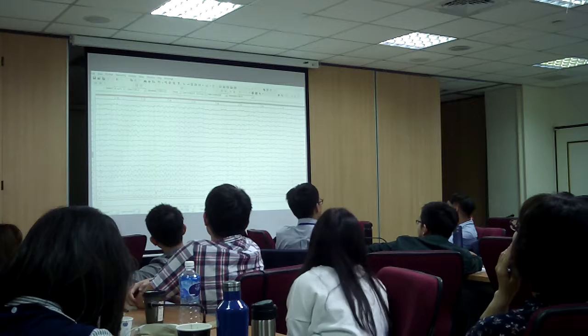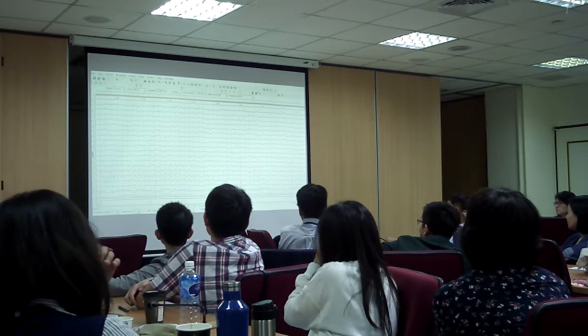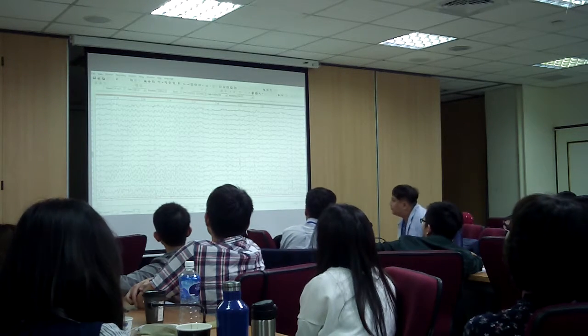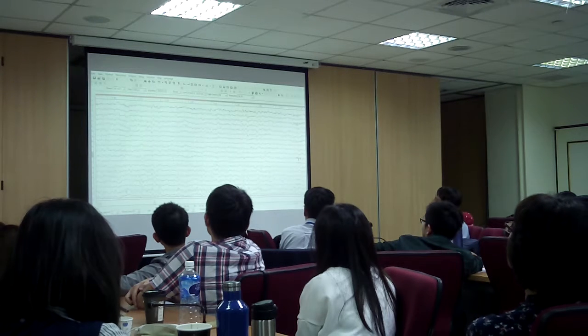Which one? P4, don't be afraid, say it. Yeah, there you go, that's the highest, yes. So that's probably your source right there. So look at that, we had the slowing with the epileptiform activity, epileptiform discharge.